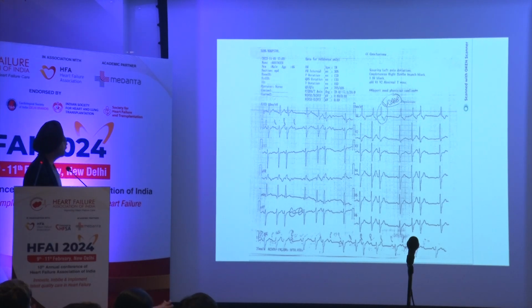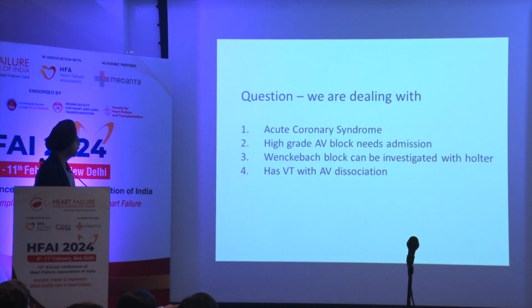You can see his heart rate is 78, blood pressure is fine, and this is what his ECG is. So, what are we dealing with?